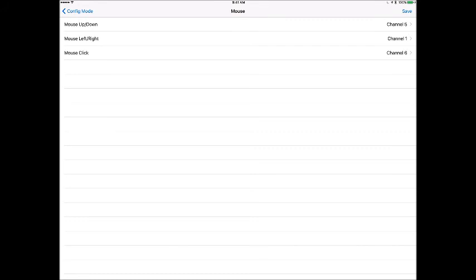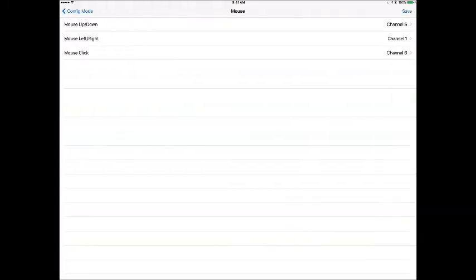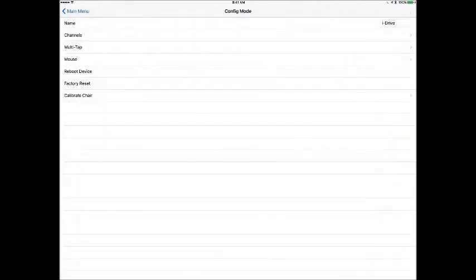We will have a video kind of showing it a little bit more, but this is where you would do some of the programming. And of course, if I save it, I save it here. If I don't, and I get out of it, when I come back into it, everything's back to how it was. So again, the factory reset, the reboot, we went over that a little bit. Those are really nice technical features that you could have with it.